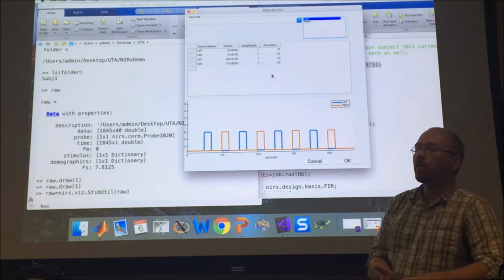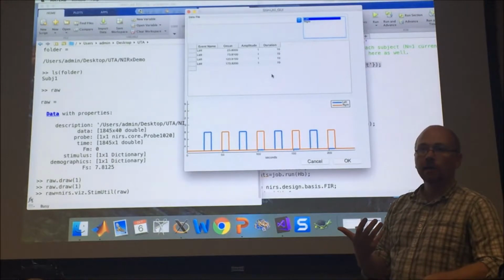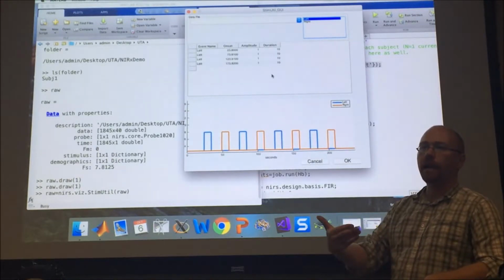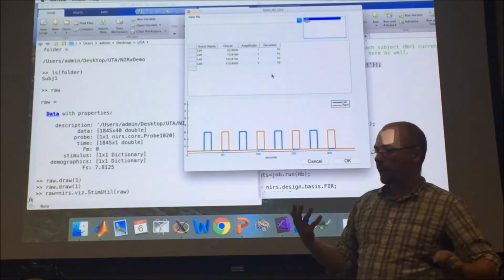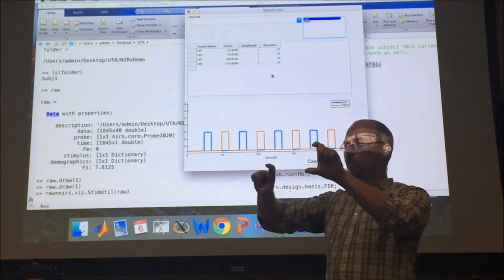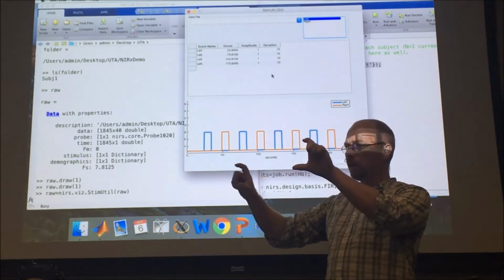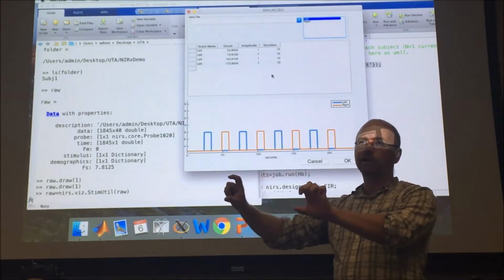And what's going to happen when I start to do the general linear model is I'm going to have additional options that allow me to look at how that amplitude modified the response. So what I would do in that case is I would have 2 regressors. One that's constant, every block is the same height. The second regressor, the height of the block varies with reaction time.